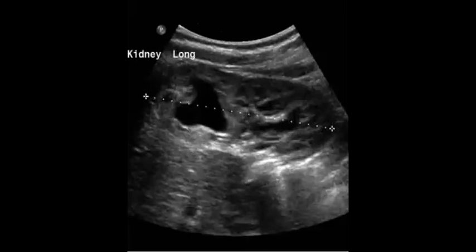Yes, upper ectopic, lower reflux. Perfect. R with R. And the lower moiety is more prone to reflux. R with R. Reflux in the lower moiety. Okay, so I see that everyone knows this. Already we see how it looks in the MCUG, and you should comment on the posterior urethral valve and say that it is normal and there is no posterior urethral valve.